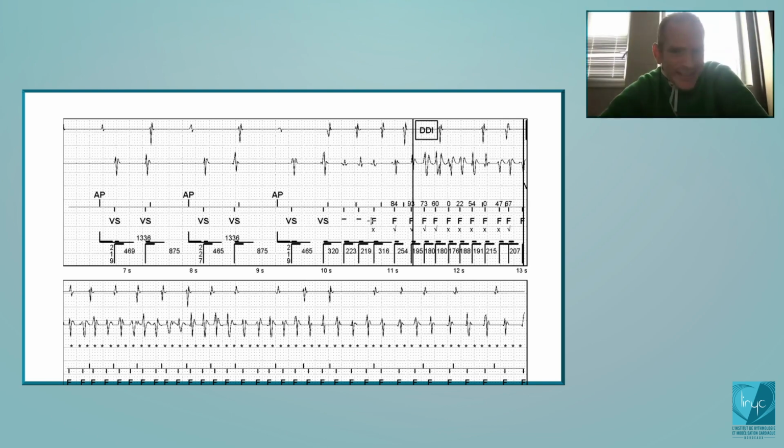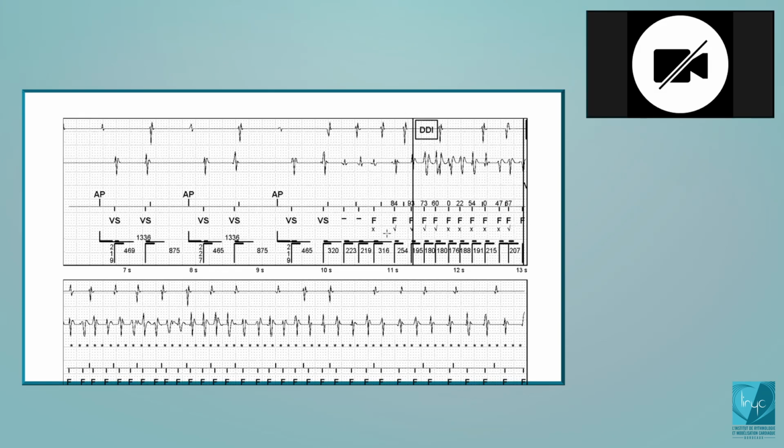Okay. So that's very, very important to understand. For most of the tachycardia, the very first cycles are unclassified, and then when there is a constant acceleration, the first cycle will be classified as VF. Okay, so then what happens? And then we have an implementation of the counters.